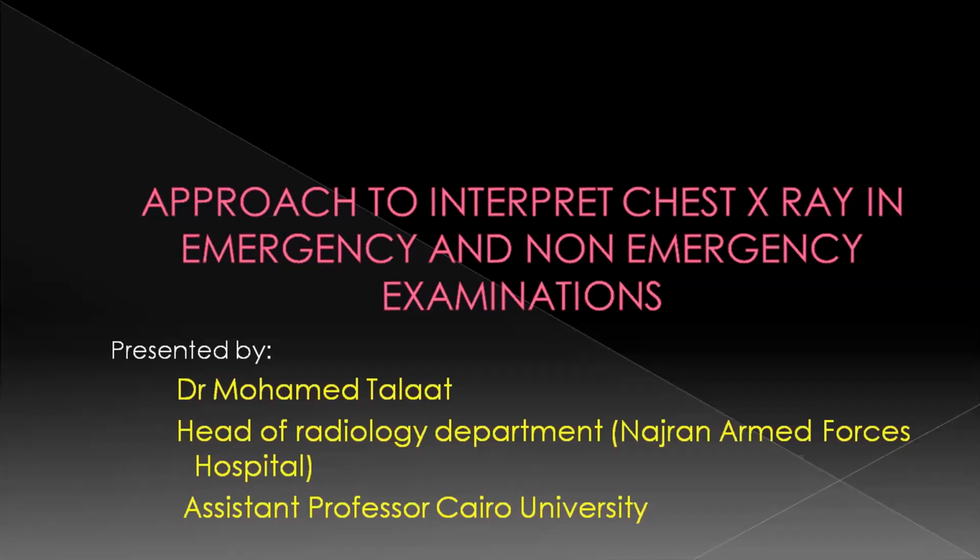Before we start, I invite you all to join my lecture to interpret emergency and non-emergency examinations for the chest. And I need to notify you that, to be honest, chest X-ray is one of the most difficult examinations that you have seen. Why? Because in the chest X-ray, there is a summation of different parts of the body in one projection, either PA projection or lateral projection.